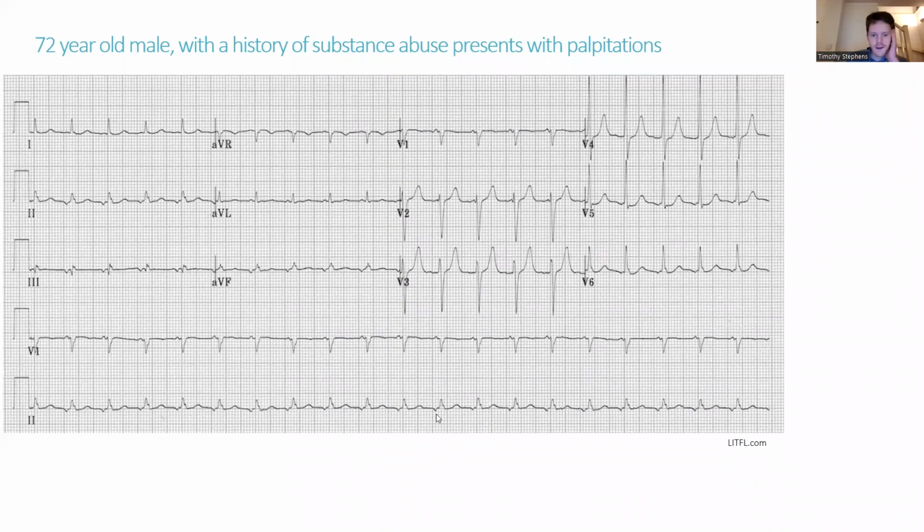You can see here, that looks like a P wave there, and that looks like a P wave there. Oh, there's a P that's followed by a QRS. So somebody's put in the chat, it's inverted. Exactly, it is inverted. It is different. So let's finish the ECG first, and then we'll come back to that, because you're right, there is something different there.